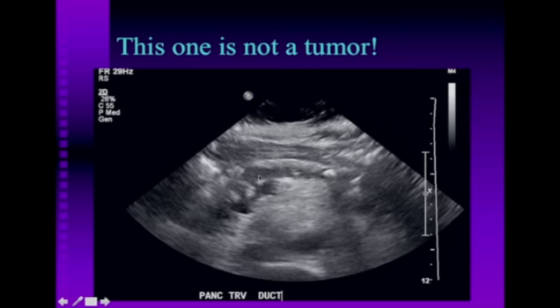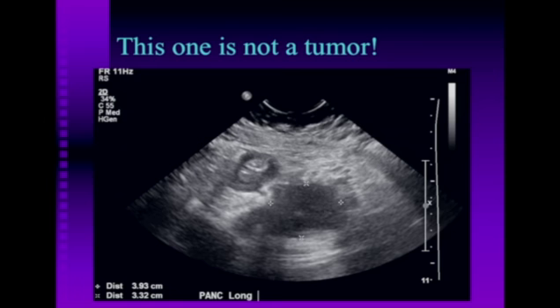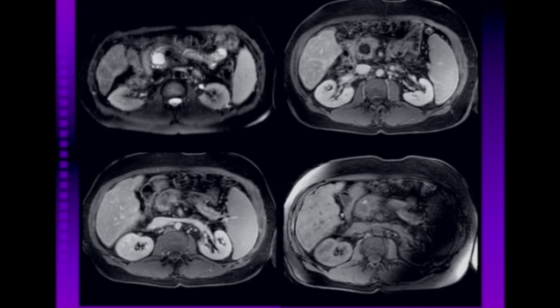And look at this all through here. Now, one hint might be these echogenic shadowing structures within the pancreatic parenchyma. But again, my sonographer shows me this image of an infiltrative hypoechoic lesion. I am thinking tumor all the way. So this patient had an MRI, and I'll draw your attention to several different points.